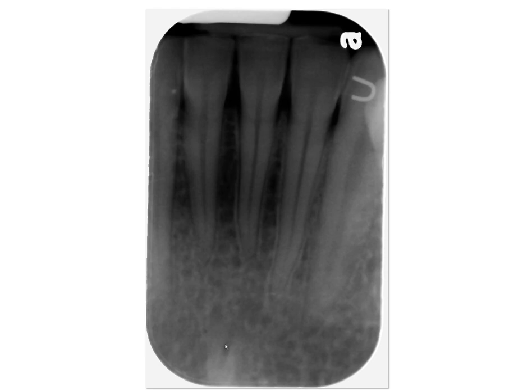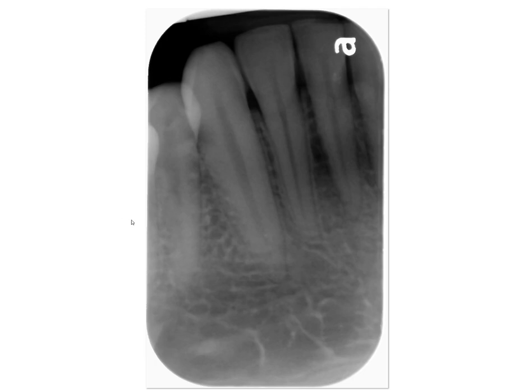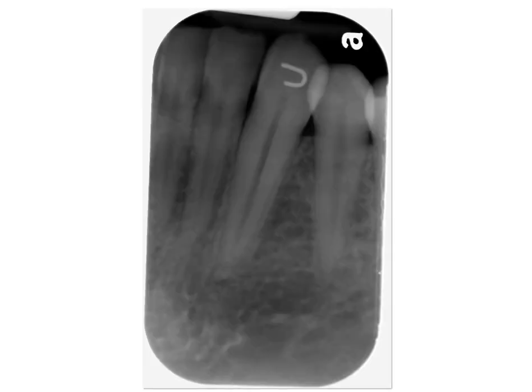Right here, do you see this distinct small radiolucency? That's the lingual foramen, and just inferior to that, this opacity represents genial tubercle. Let's see a very important structure. Just keep that in mind. Trabecular bone patterns constantly change depending on the region of the mouth. Again, the trabecular patterns are much closer to one another in the upper half of this mandibular bone, and you can see marrow spaces are a lot larger in the inferior half, and that is very common for most patients. And same thing here.